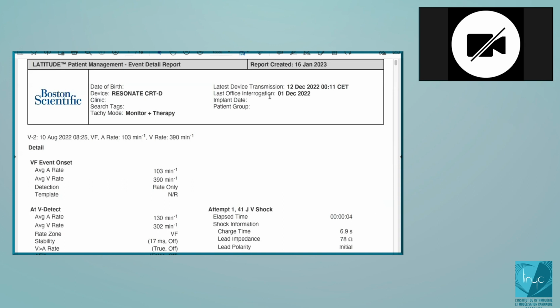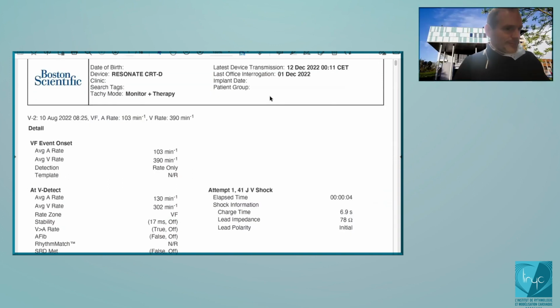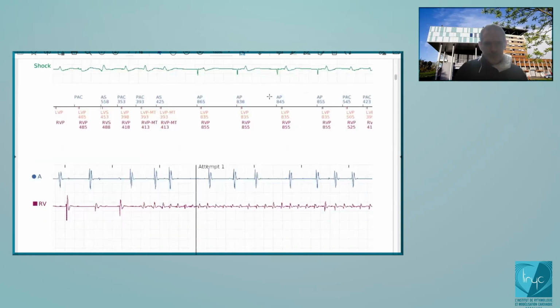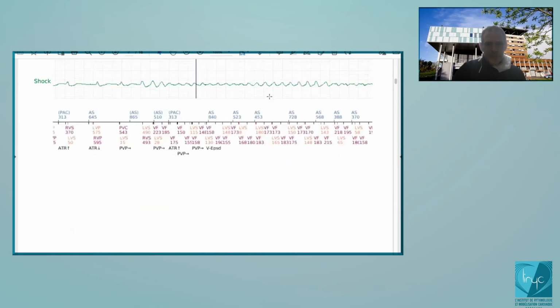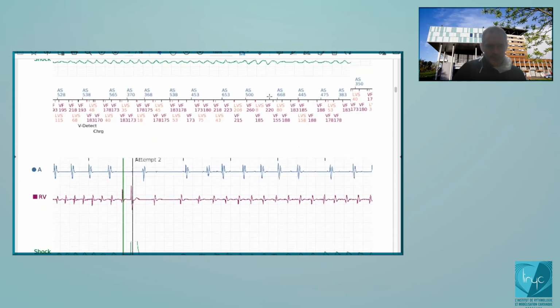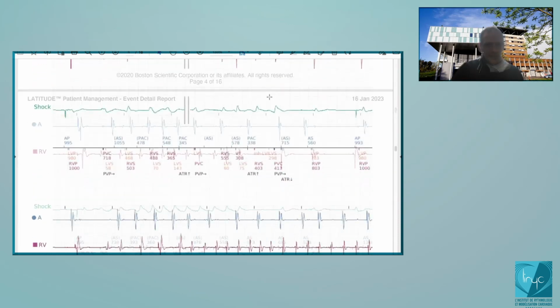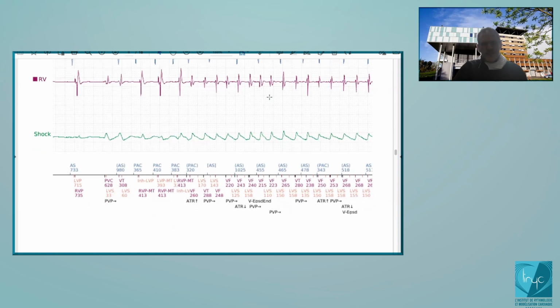Okay. 1 or 2 tracings, and that's the end. I will show you briefly, but try to find it. So this is an episode of arrhythmia, ventricular arrhythmia, just so that you understand another parameter which is important. Here, you see this marker, sorry for the delay, this one, V episode end. You see this one? Yeah. Okay. That's something you need also to understand.